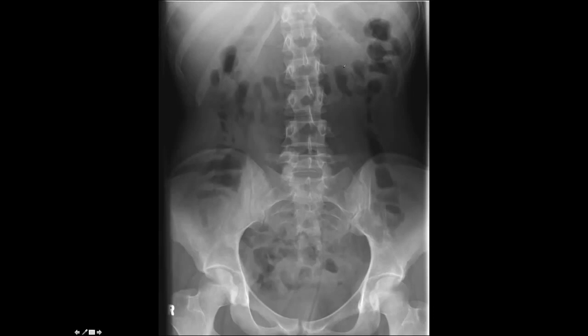So we've seen the bowel gas pattern, and no obvious extraluminal gas here. Most of the time you'll be looking for gas patterns in the liver, i.e. biliary gas, portal gas, or outside if there was an abscess or anything. But with a plain film, there is only so much you can tell. So that's the normal abdominal X-ray.